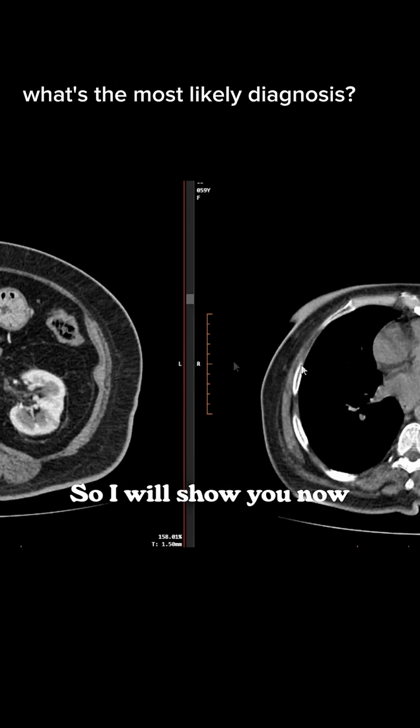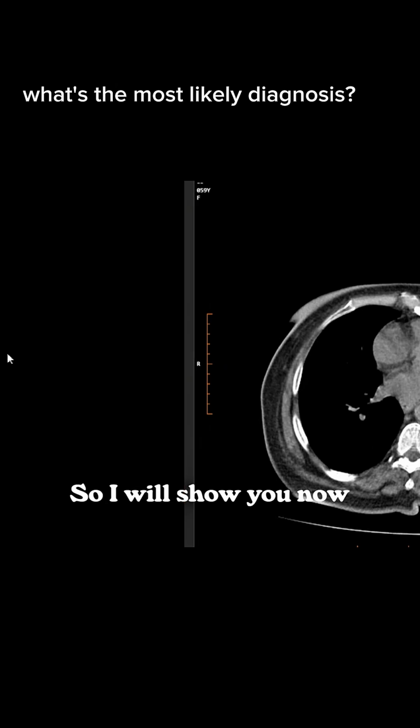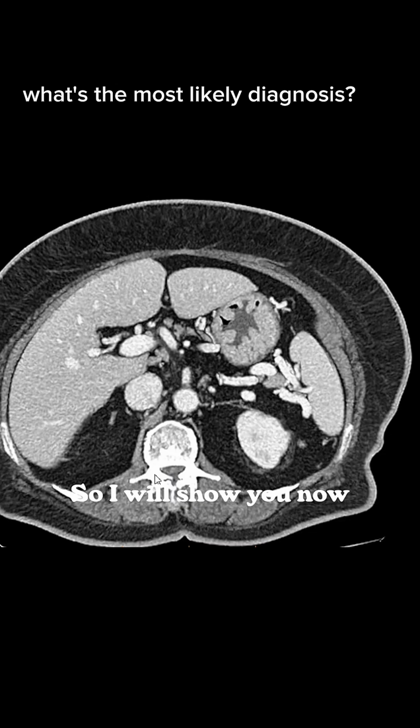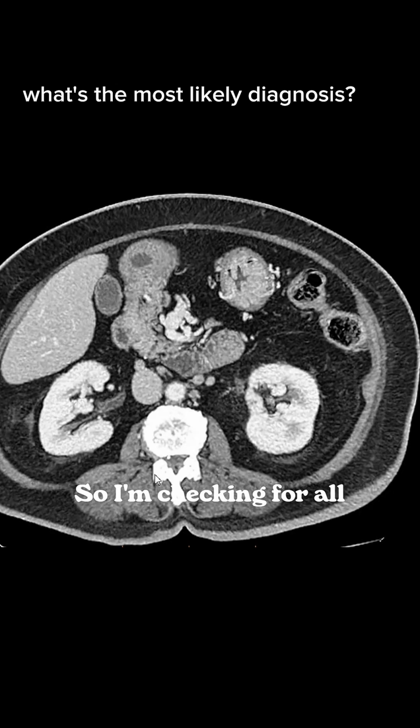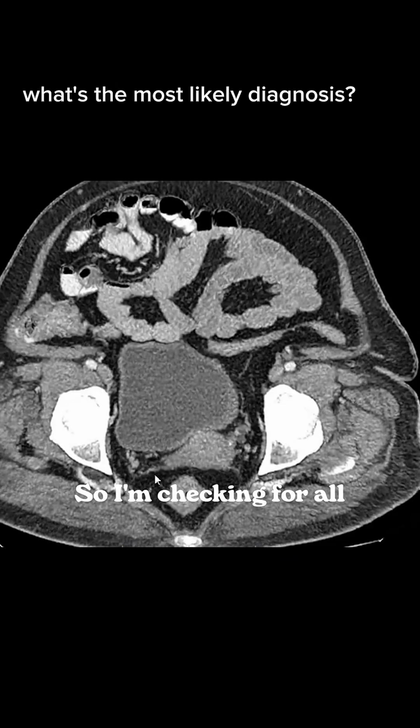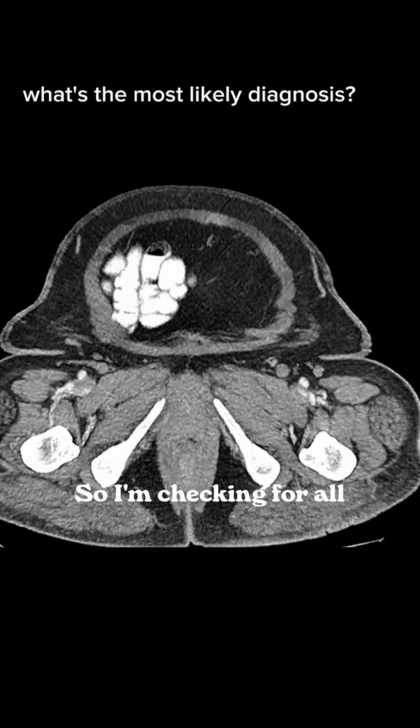So I will show you now the post-contrast in different phases. I'm checking all the images in this case.